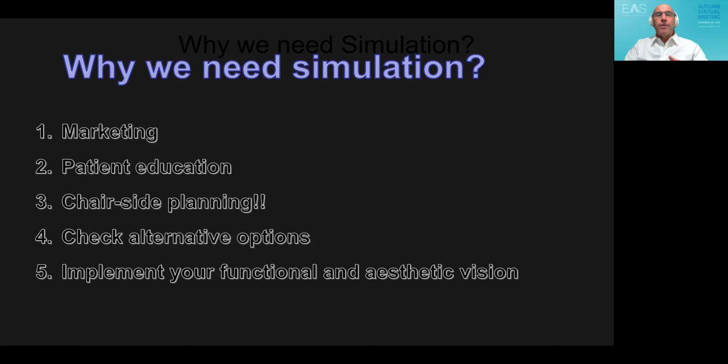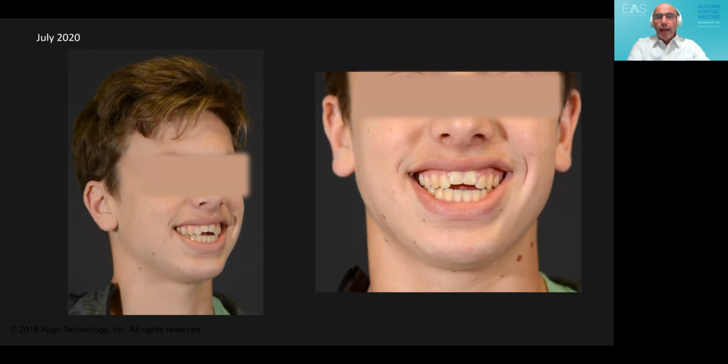Yes, it gives you a suggestion, but then you have to revise it and implement your input into it. And of course, the last point is the share, save, and send. I will get into more detail on this feature later on. So let's see, for example, a case which I can show you how simulation really helped me with this patient.